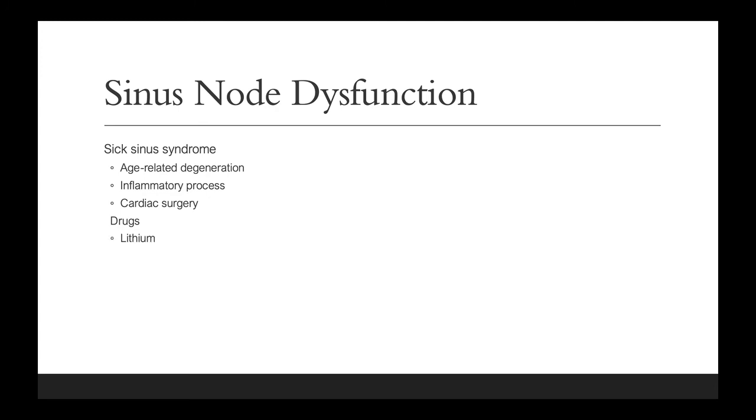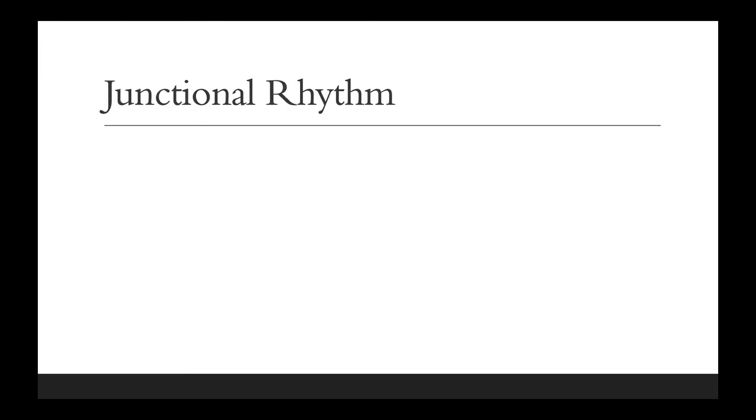And various drugs like lithium, digoxin. So these are conditions, obstructive sleep apnea, which could lead to sinus node dysfunction, and which manifest as either sinus pause or sinus exit block on the ECG.